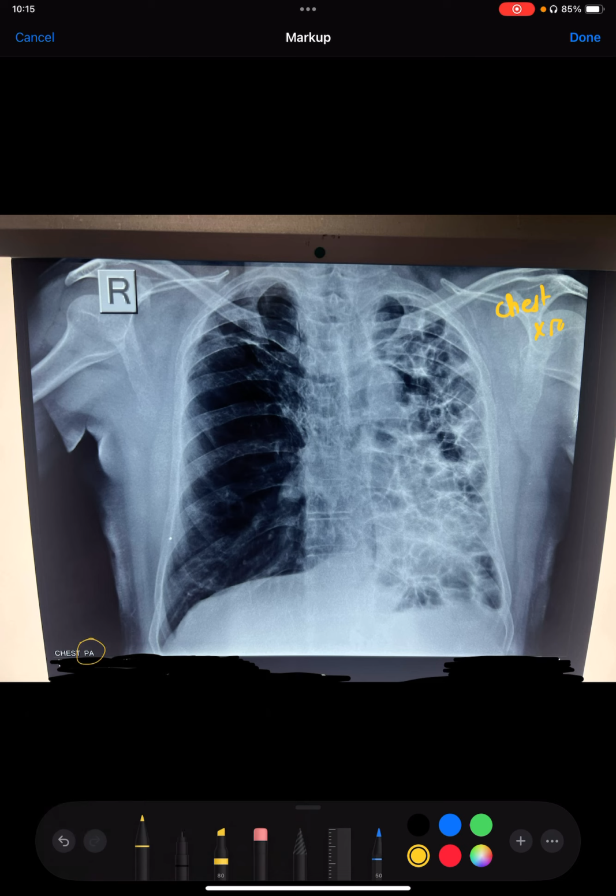So obviously this is the left side, this is the right side, this is labeled as R. Now what we can see is all the lung field, which you can very clearly make out. Now in here, the angle is completely clear, so there is no effusion. And most of the time, if the patient has heart failure, we can always think of effusion. Now this side of the angle is not very well visible because there are so many irregularities in here. The other thing we can very clearly see is that there is no right side effusion.